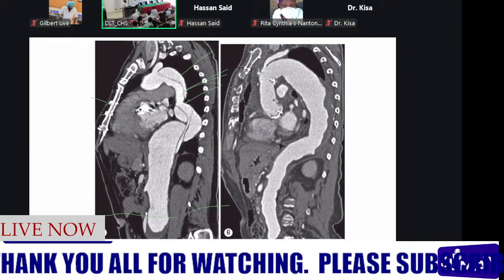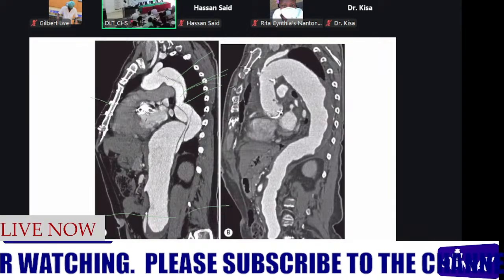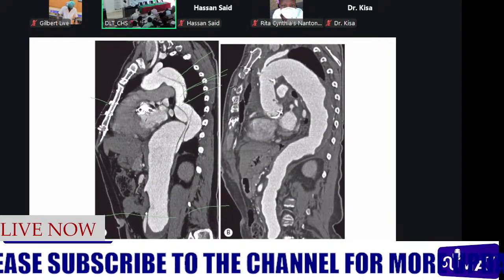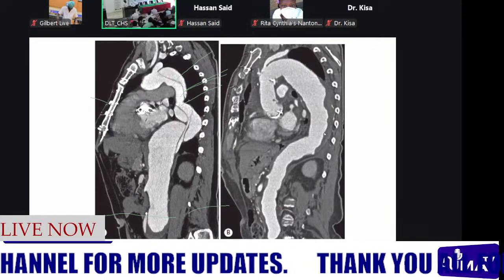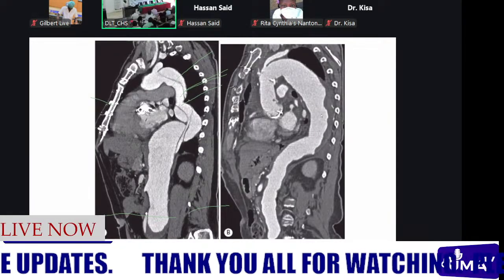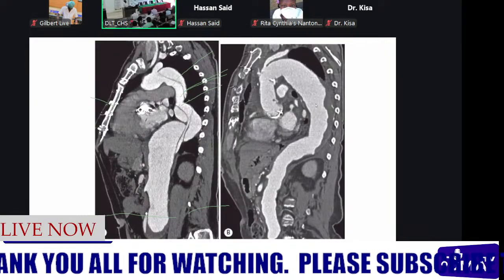Then the other thing, we can look at the internal margins. In aortic dissection, we see a very nice, clean, and smooth margin, whereas in a thrombosis, we have these rugged, irregular margins internally. So those are some of the few things that we look at to differentiate a thrombosed aortic dissection from a thrombosed aneurysm.